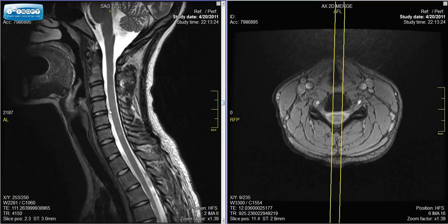And again, as we saw in the lumbar spine, the larger, lighter areas are the bones, and the spaces between are the discs, which once again are made out of cartilage. The spinal canal is here. Now, within the spinal canal in the cervical spine, we have the solid spinal cord, which is this gray stripe.